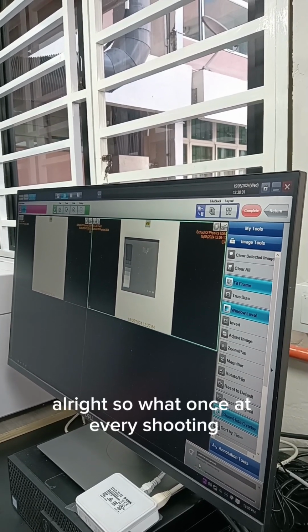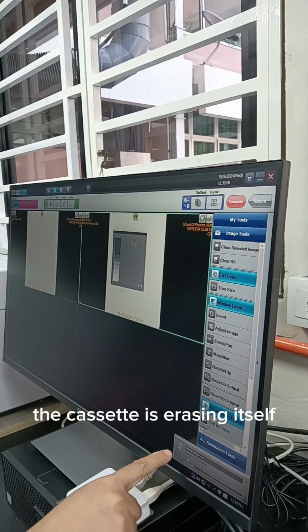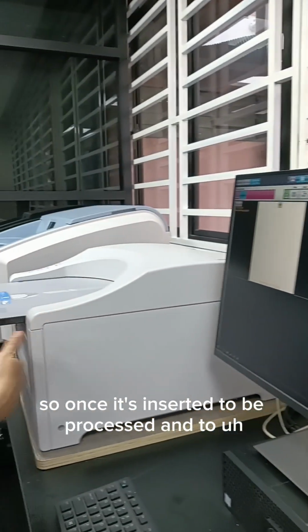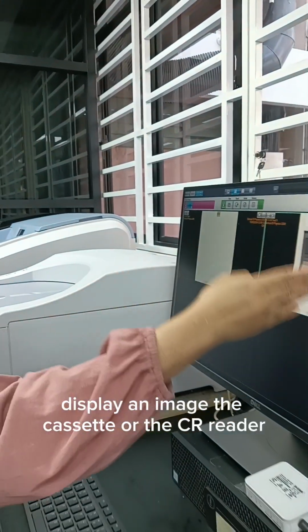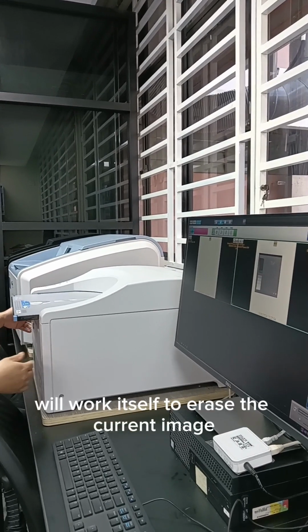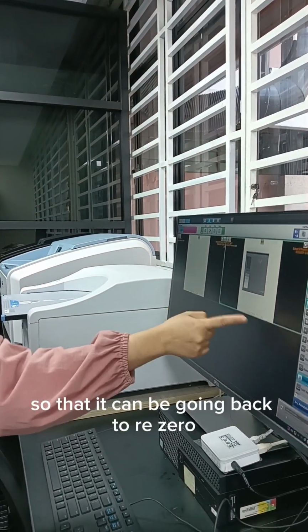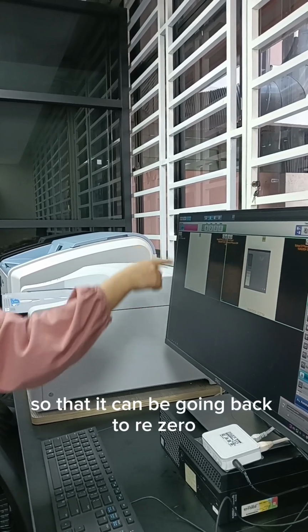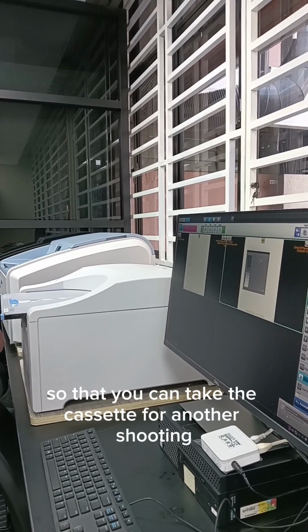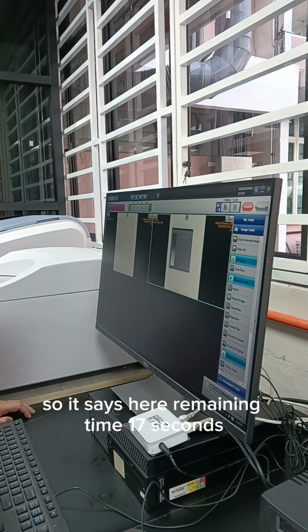Alright, so after every shooting, the cassette erases itself. Once it is inserted to be processed and to display an image, the CR reader will work to erase the current image so that it can go back to zero. It will appear as zero so that you can take the cassette for another shooting. It says here, remaining time 17 seconds.